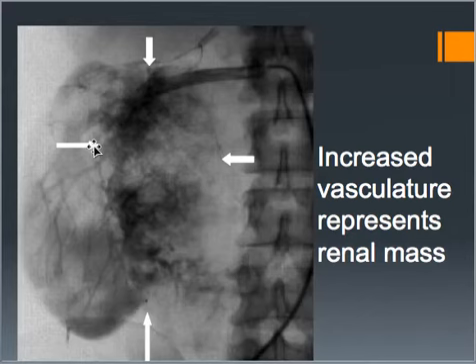This one is a kidney again, so here you can kind of see the outline of the kidney, and then you can see the blood vessels in the kidney. But within these arrows, all the way through here and up to here, is a renal mass. Usually you can tell that because there's increased vasculature. See all the different vessels that are intertwined here and here, they just look black because the contrast is so overlapping. So this right here is a renal mass.